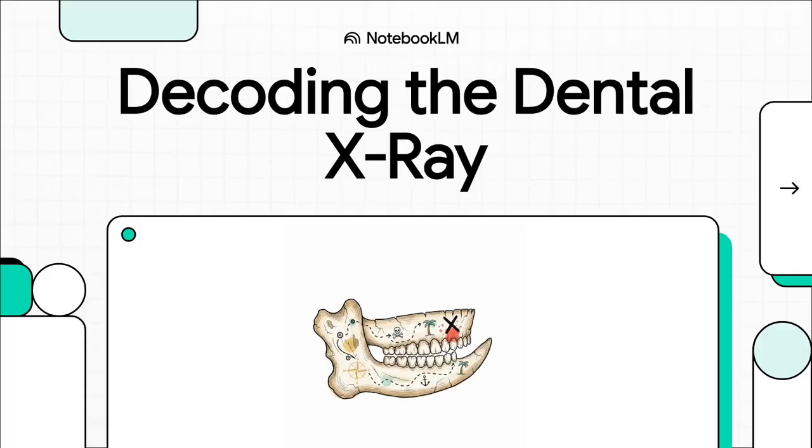You know those shadowy dental X-rays? It's so easy to see them as this really complex, maybe even a little scary medical image. But today, we're going to flip that idea on its head. We're going to look at this thing not as some confusing puzzle, but as a detailed and, believe it or not, totally readable map of your own jaw. So let's unfold this map and get started.